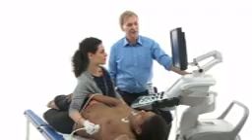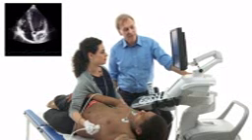People are always afraid of assessing the right ventricle because they say it's very difficult. Well, it's not as easy, I agree, but we will show you how we can make it simple and where you can extract the most important information you need, namely, how is right ventricle function and what is the size of the right ventricle. Both issues are very important in the assessment of critically ill patients and also patients in normal cardiology situations. So Anna, how would you go about imaging these patients?